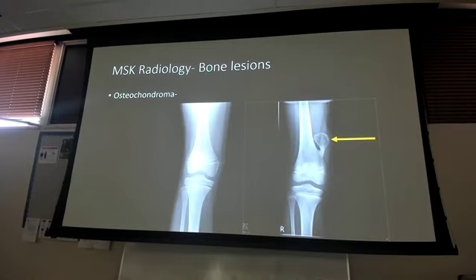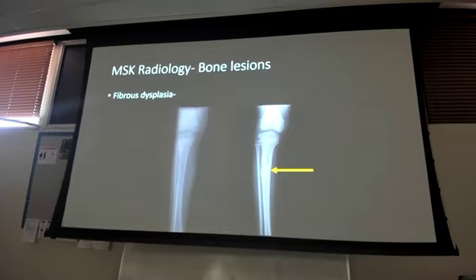What am I going to do for this? Depends. Is it painful? Probably is. Usually it comes up in, is this peds or adults? Peds, look at those physes, right? Usually it comes up in kids, usually they come in because it's painful. They'll go in, ortho will take care of it. But there's the osteochondroma. It's basically just off of the side of the bone, a little growth.